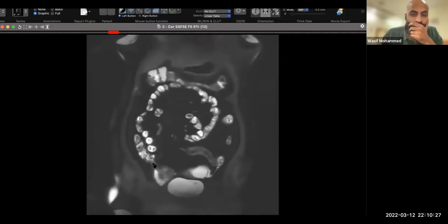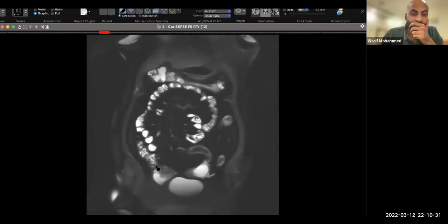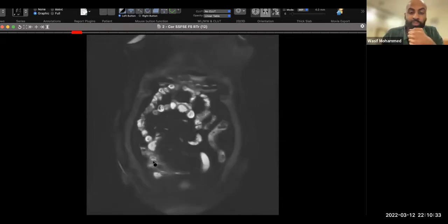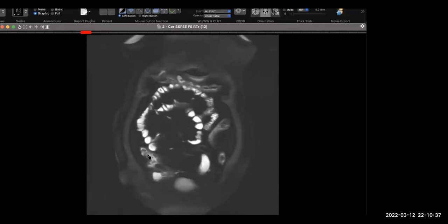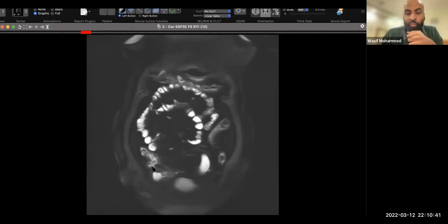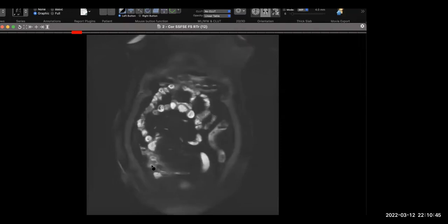with obvious proximal holdup of contrast in this case. So where's the proximal segment? That is my question. You're saying there's no proximal, this is the terminal ileum, and where's the more proximal segment? I can't trace.